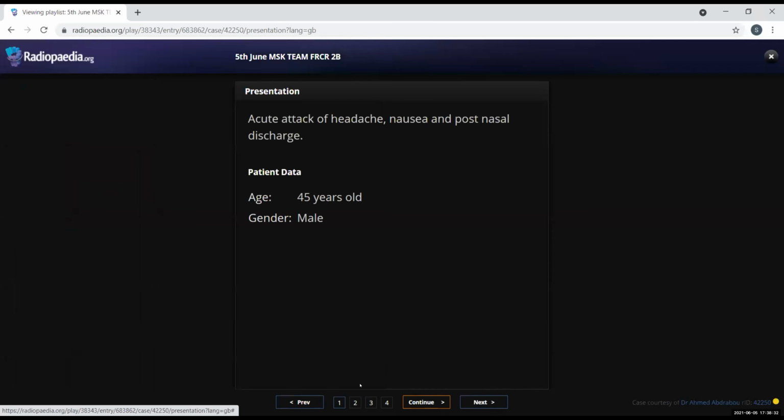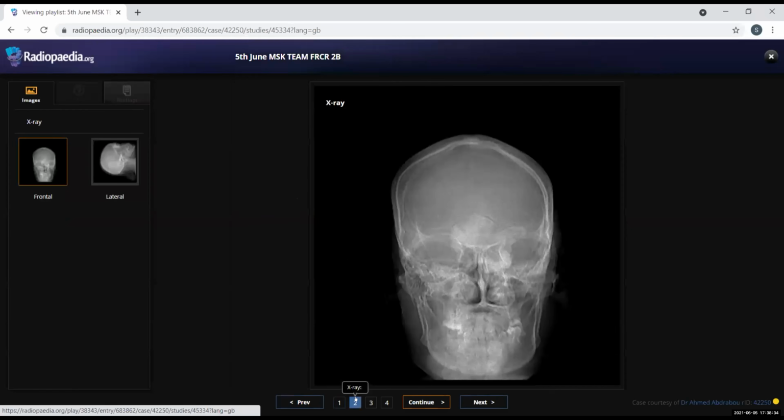Next, we had this ivory osteoma. You rightly said the polyposis one, that's the Gardner syndrome, in which we have the polyposis, intestinal polyposis, the desmoid tumor, and the osteoma. Okay, so that was also fine.